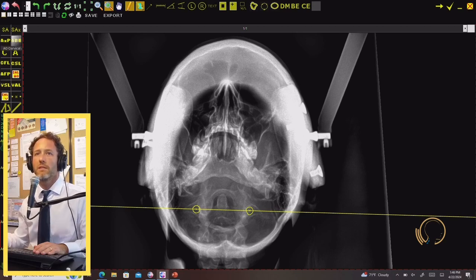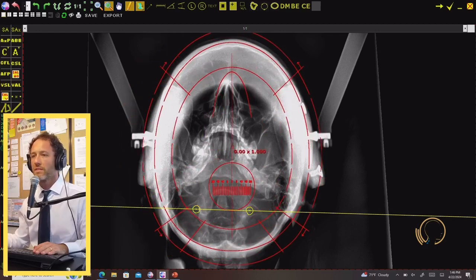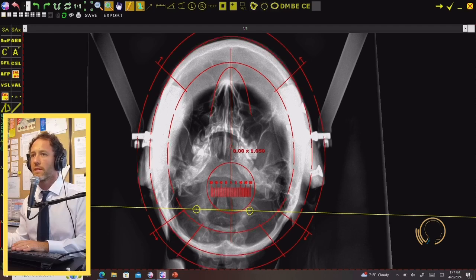So you're going to see it's listed as VSL. With this tool, you're going to notice that you got that entire oval shape, and this is what can get you in trouble, and it's one of the things that makes AdvO, I think, unique, is they're focusing on the zone up top here because that entire skull truly can be unreliable. In the late 90s, they really dialed in focusing on that anterior portion. And then these two windows that are going to be, let's kind of circle them here.